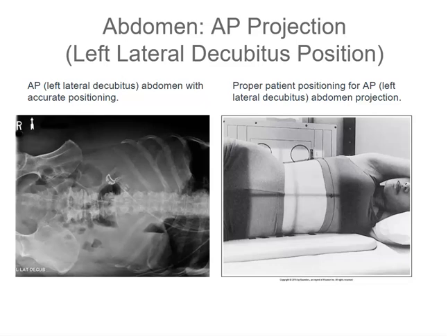The third lumbar or fourth lumbar vertebra should be centered at the center of the exposure field, dependent upon hospital protocol. The right hemidiaphragm, thoracic vertebra, right lateral body soft tissue, and iliac wings are to be included within the exposure field.